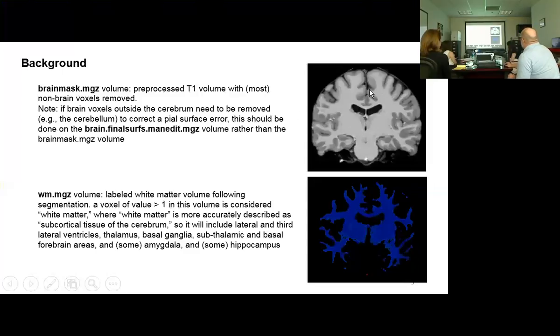They're not nearly this. The intensity isn't this blotchy and uniform, and that's actually a very important step, and is very handy when the data quality is pretty good. It's not so good when the data quality is bad. So you can get things like it can pop up and make really high intensities for some white matter in some places and not in other places. And we'll see some examples of that.